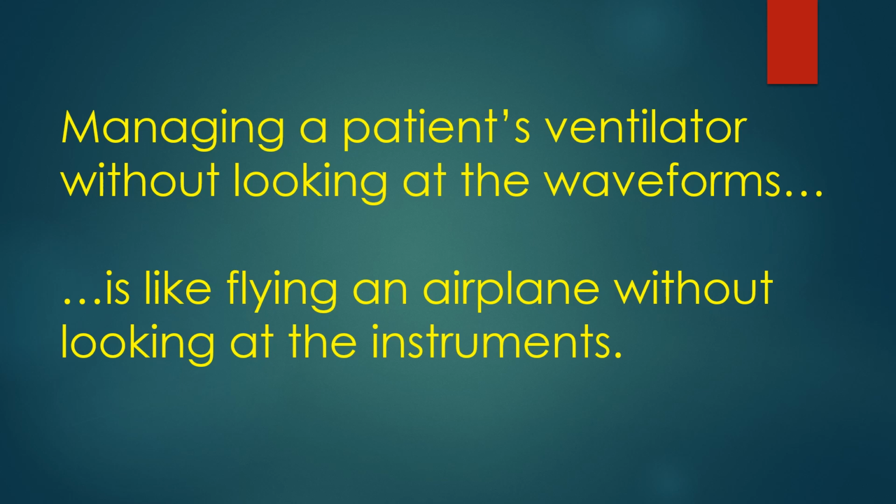Today's ventilators come with graphics, but they're not useful if we don't look at them or if we don't understand what they are telling us.